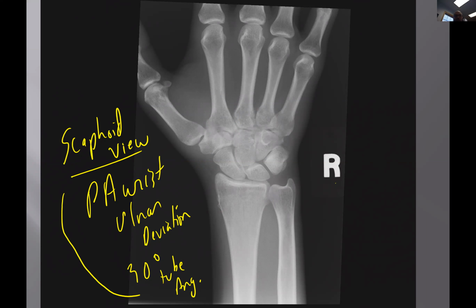Now, just look. Everyone look at the distal radius here. Look at the distal ulna. Okay, now look at the distal ulna. I mean, it's beautiful. It's really homogeneous. There's no, but now look at the distal radius. It looks like there's an area of increased, kind of hazy, increased linear opacity going across. Take a look at it. Do you buy that?